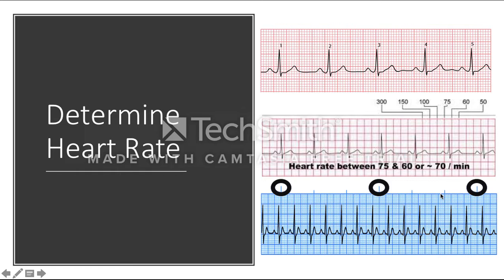If you do not have tickers on the top of your ECG strip, you can create your own. So we would make a mark on this dark line and then count 5 big boxes. 1, 2, 3, 4, 5. This makes 1 second. Let's show 5 more boxes. 1, 2, 3, 4, 5. This makes 2 seconds. And we would continue that till we got a 6-second strip.